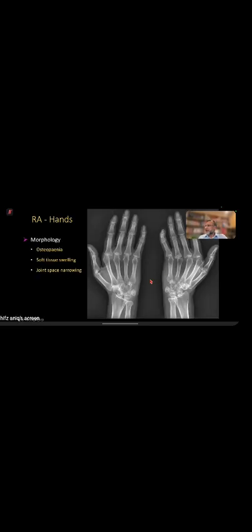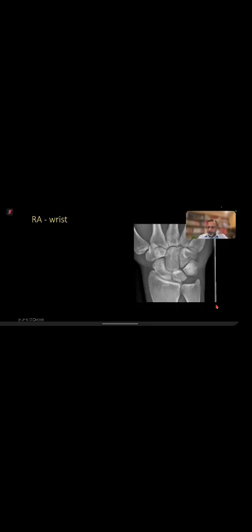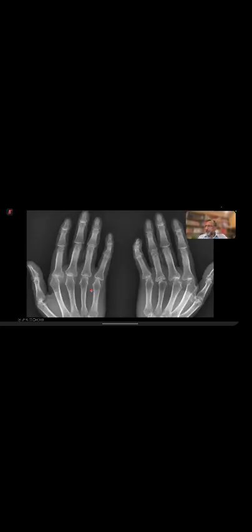Another case, same thing: multiple established erosions. Not much soft tissue swelling because they are not very acute, but it can happen. And you can see some secondary degenerative changes and subluxation there. Same thing as in the magnified view of the previous image.